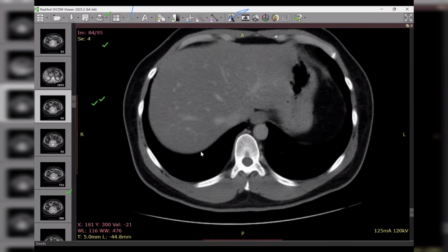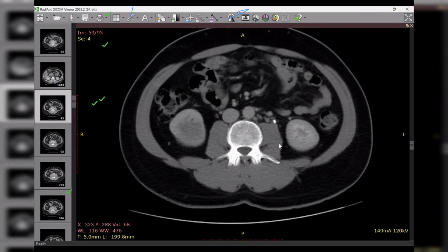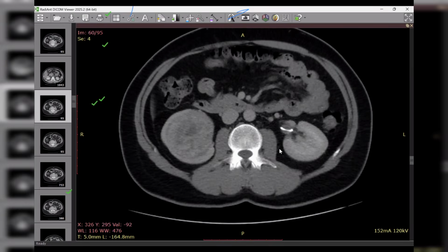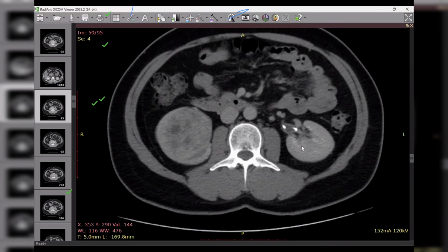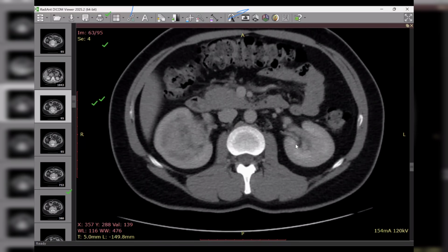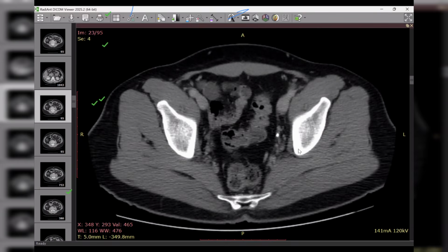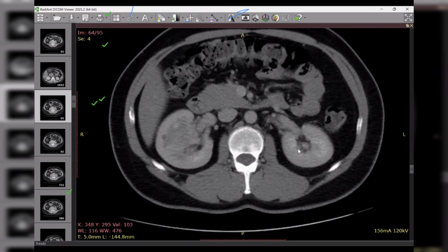After you finished the right side, you went to the left double J, you highlighted the tube. Then the most important before finishing, if there is any residual back pressure or not, right or wrong? And if there is any superadded inflammatory process on the left side. Yes, correct.